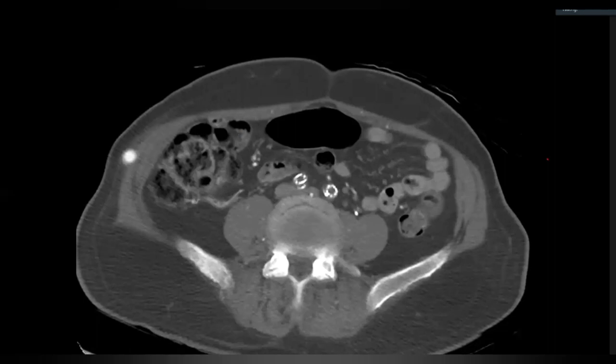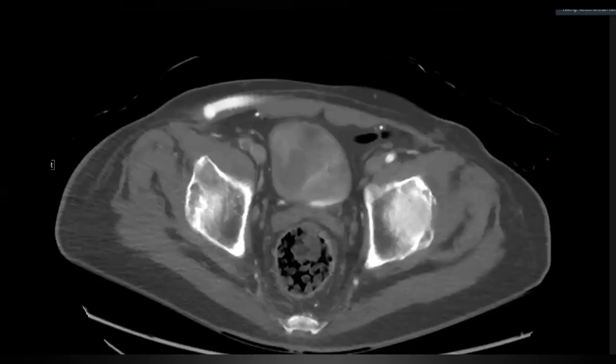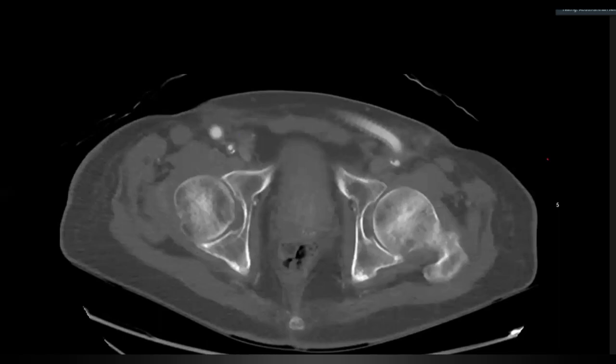Oh, okay, all right. You did very well to pick this up. A lot of people would have ignored that and just carried on with the film. So you may not have seen this before, but you can see that this tube comes from the top, and then it divides and it gives blood supply to both lower limbs. So you can see this appearance.